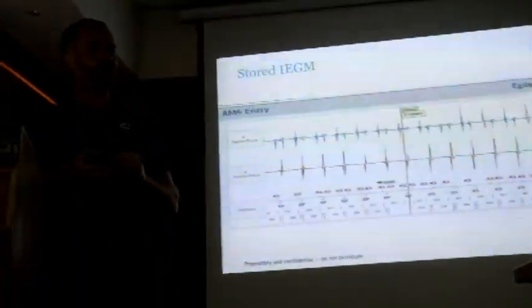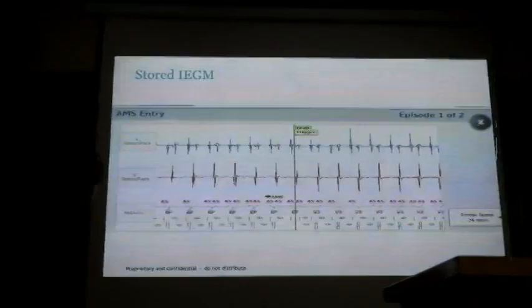I have a patient, but she has not received the pacemaker. But from her EP study, this is the right atrium, this is the left atrium, and there is a big distance, timing wise. Sometimes you see them out at like 140, but this is 150. This is congenital heart, and they're important, right?